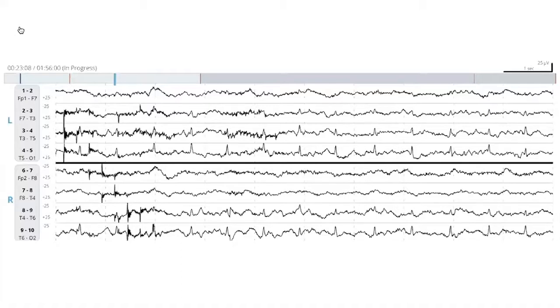I think the timing of it being so precise is what makes it more likely to be EKG. And the occurrence across the entire recording. And of course, the interval being similar to EKG, 60 to 80 beats per minute. Right.